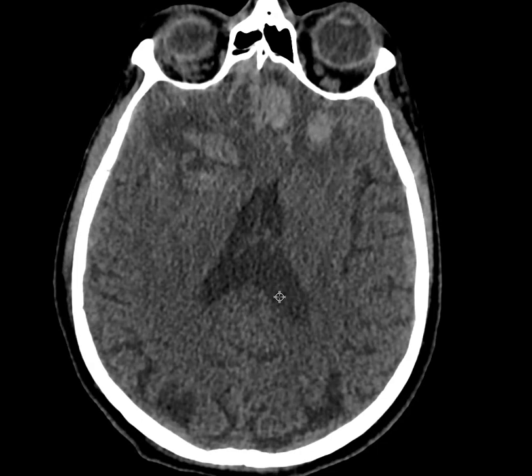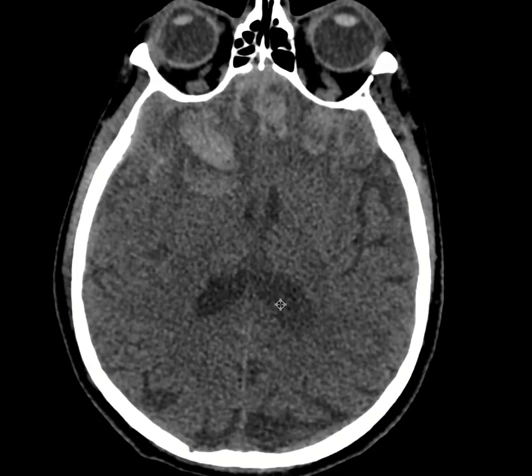Make sure that you mention if you see something. Sometimes we cannot be very firm on subdural versus epidural, but if there are some classic findings for epidural, make sure to put that in the report.